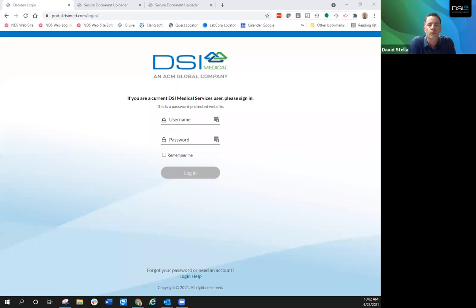Additionally, the chain of custody form upload. I know many of our clients do tend to get a copy of the chain of custody form before we do. This will give you also the ability to do an upload right into our system rather than having to fax. There's a unique upload feature that will be very beneficial for you.